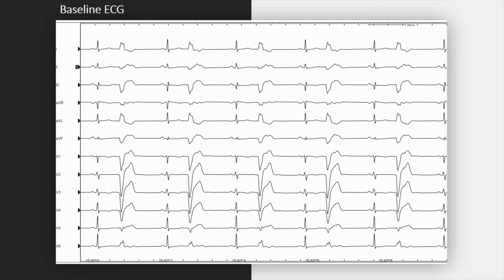Ventricular arrhythmias from the right ventricular papillary muscle are much less frequent than arrhythmias from the left ventricle. In general, such arrhythmias have a left bundle branch block morphology and the QS pattern in lead V1. Among these arrhythmias, the focus in the septal papillary muscle resembles the source in the RV outflow tract on ECG, especially when the focus is on the conus papillary muscle. Then the QRS is positive from lead 1 to 3.